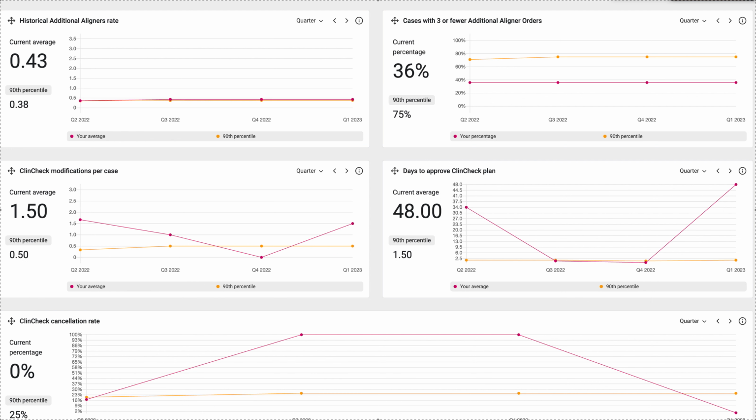And as always, now I get the joy of giving this disclaimer before every video where I show a screenshot of something from a company. So this is a screenshot from an account that I was given permission to share. This is the property of Align Technology. It is not my IP, it is theirs. I'm just showing what it looks like.